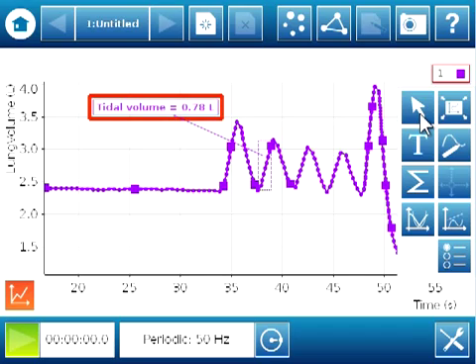The 0.78 liters, that is the amount of air moved in and out of the lungs during normal breathing, is much less than a person's lung capacity. To determine another value called vital capacity, we'll need to analyze the change in volume when a person exhales forcefully after taking a deep breath. For this measurement, we'll analyze data that corresponds to the person exhaling as much air as possible out of their lungs. I'm going to move my graph over a little more.